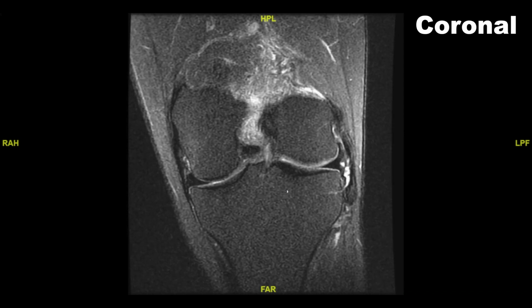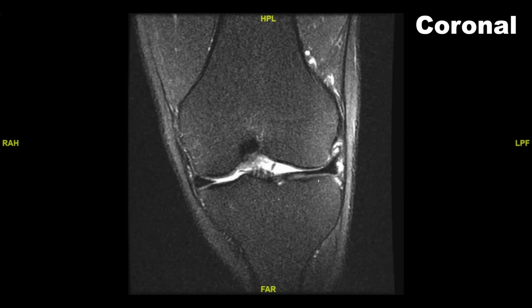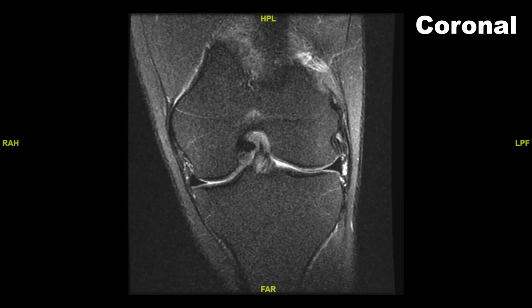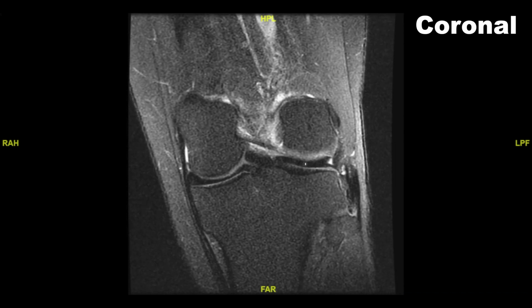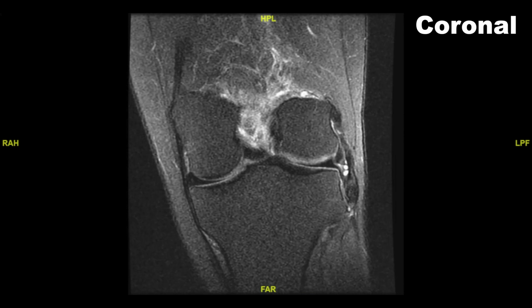So we'll go back to the front of the knee now, to the lateral meniscus. And so here's part of the lateral meniscus. And as we move towards the back of the knee, here's the shape again. And then here's the triangle shape again. And we're going to keep moving through there. You can see how the shape subtly changes. And then again, as we move towards the back of the knee, you can see how we start to get more into a wider substance of the meniscus right here, and then there we are all the way in the back of the knee.